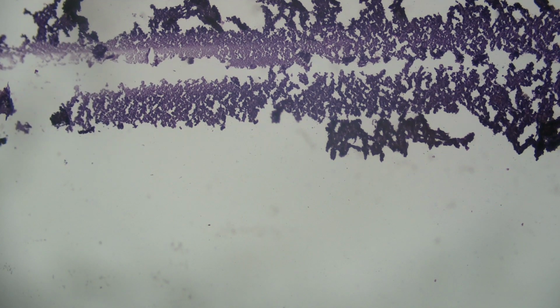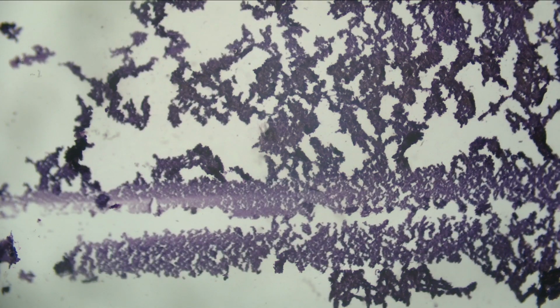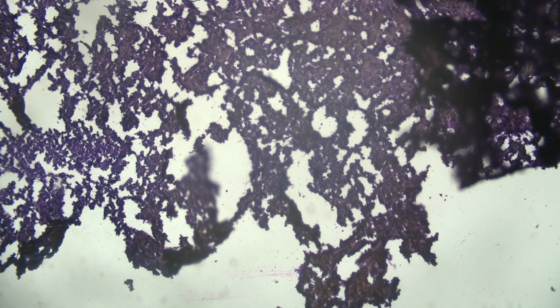and these are those cells which you were seeing in the necrosis, few of those, and I think those were inflammatory cells. Inflammatory, no. Yeah, not like really pancreatic tissue. These are all RBCs and necrosis. Doctor, what would you expect to see if this was adenocarcinoma, which can also have some degree of necrosis, but would you expect to see mucin in the background or any other indirect telltale signs that you're dealing with adeno?